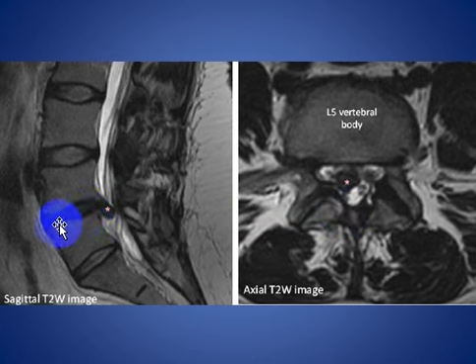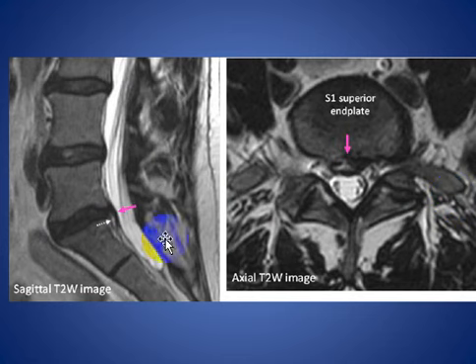And there is disc degeneration with narrowing of the disc space.